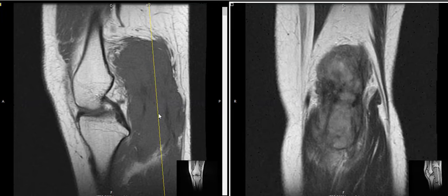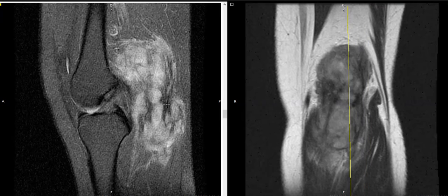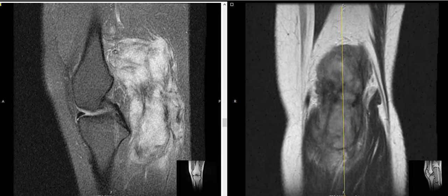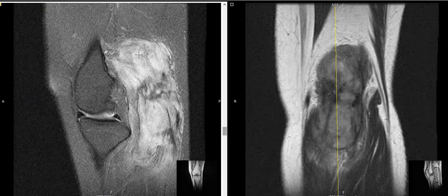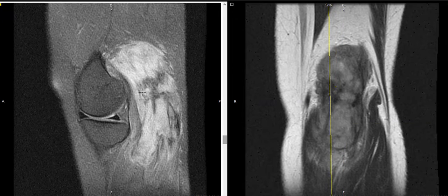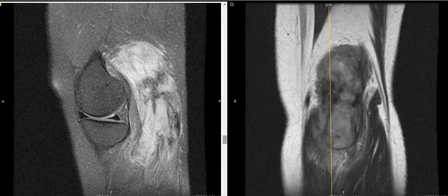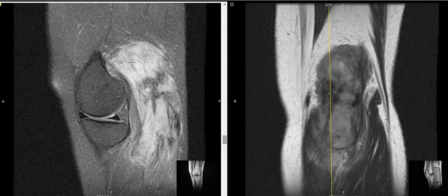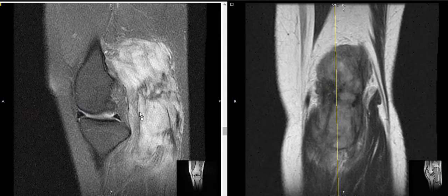We're going to put up another view here, a sagittal view looking in profile. Now in this sagittal view, we can see this large lesion in the back of the knee in the popliteal fossa. It's about 11 centimeters from top to bottom. And again, these broad sheet-like areas of low signal look like they represent bands of fibrosis and this other cellular matrix interspersed. So the question is, what is this thing?